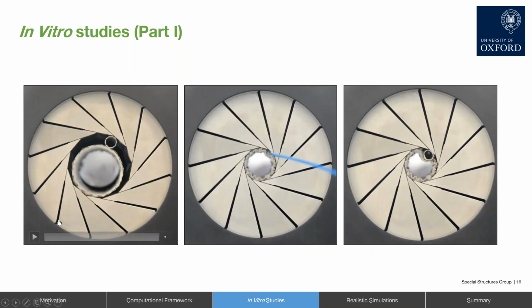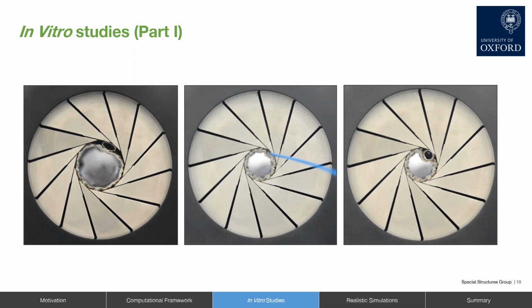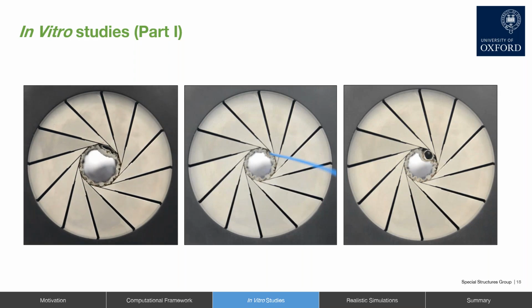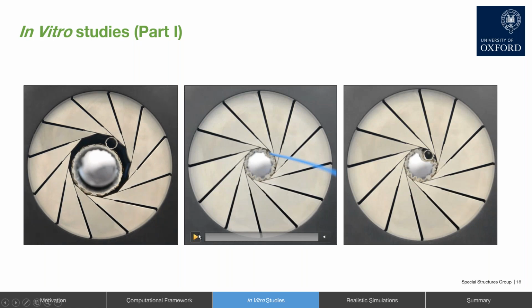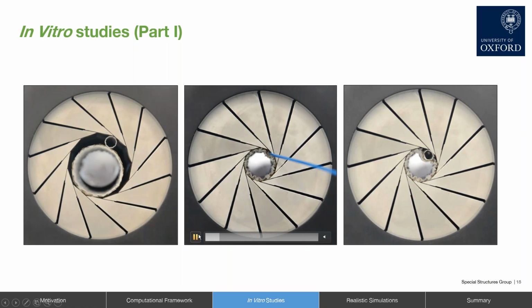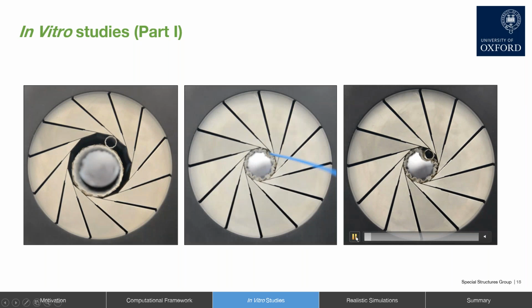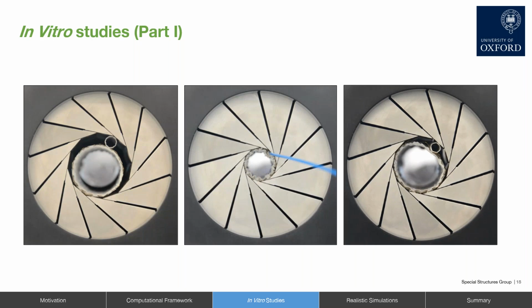Okay, so what do these experiments look like? Well, on the left, what we see here is the radial loading and the radial deformation of two self-expandable stents placed in parallel. And then the next two videos we see here are the positioning and deployment of a balloon expandable chimney stent in parallel to a main stent graft, and the resulting unloading profile of that configuration.